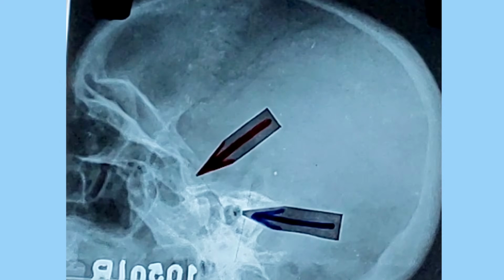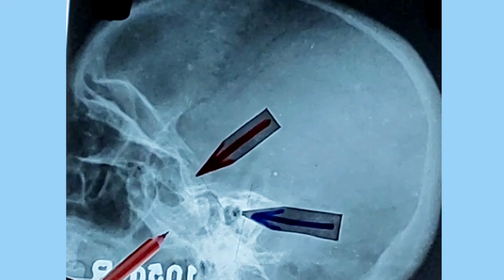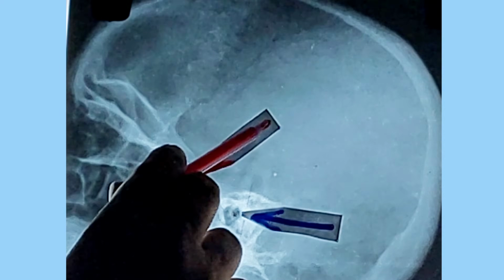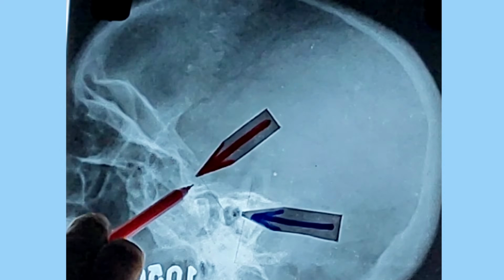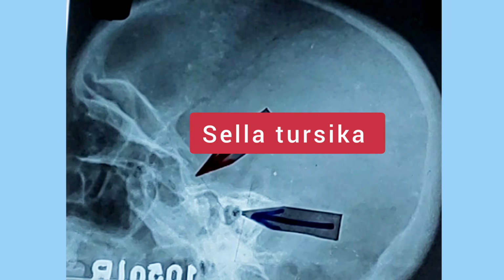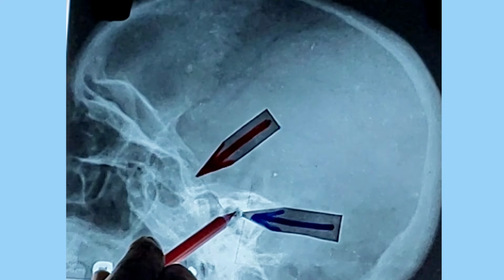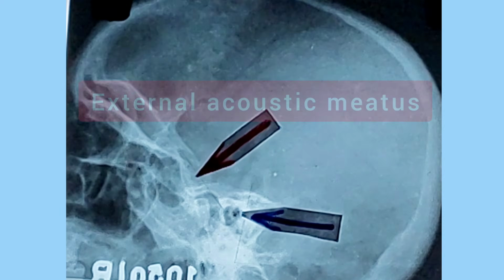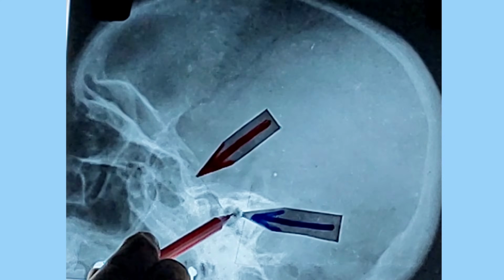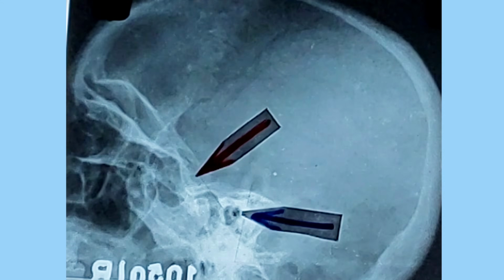If you see this X-ray, this is also a lateral view. Here mainly I will show you two important things. The arrow mark is given, and this one you already know, this is the sella turcica. This sella turcica is well visualized in the lateral view, and this opening here is the opening for the external acoustic meatus. The arrow is showing the opening of the external acoustic meatus, and other things you know from the previous lateral view of the skull.